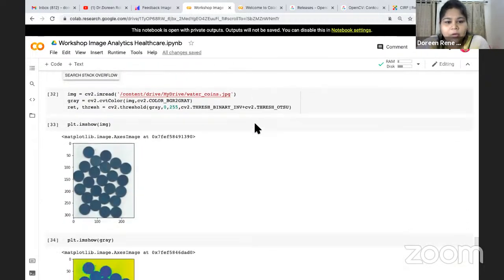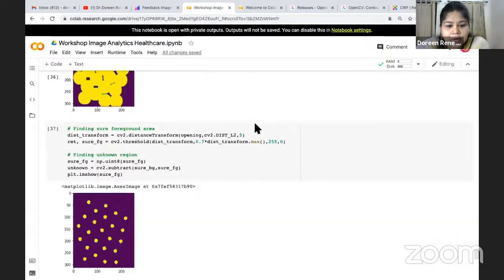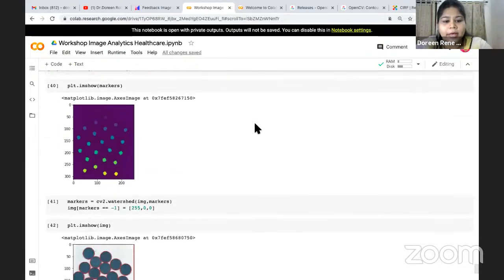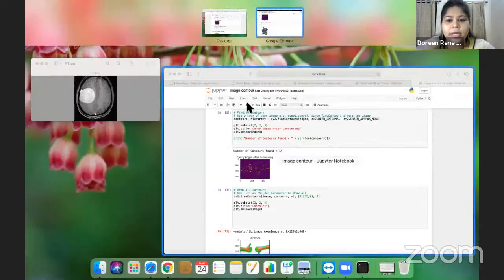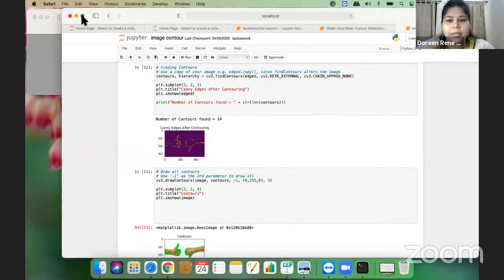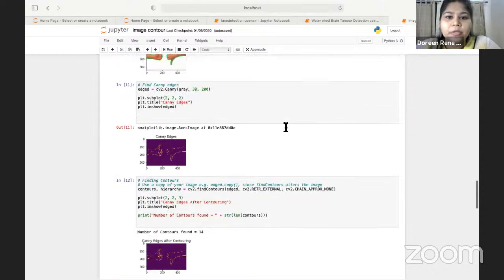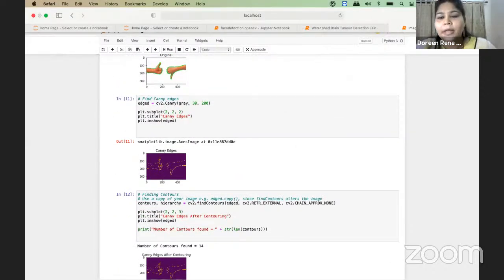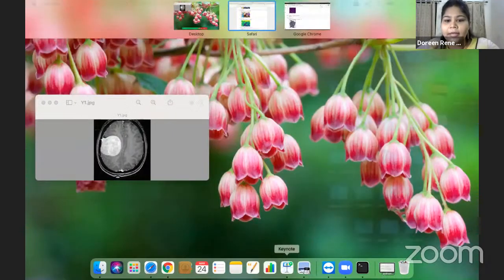And also, for another image I've done this, it is called the Watershed Algorithm. It's called the Watershed Image Segmentation Algorithm. So today we have seen OpenCV, almost 9 to 10 functionalities in OpenCV. All right. And now, as we have little time, I'll show you some demonstrations. Do you remember from my slide?